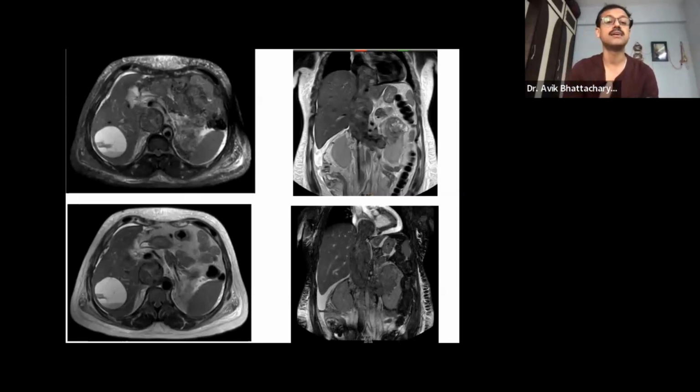Here in this liver, we could see a round lesion which is white. This hyperintense lesion is a cystic lesion. You could see curvilinear hypointensity inside. So these are the membranes. So again, this is an MR picture of hepatic hydatid disease.